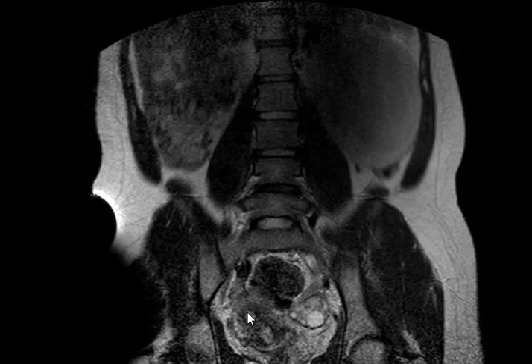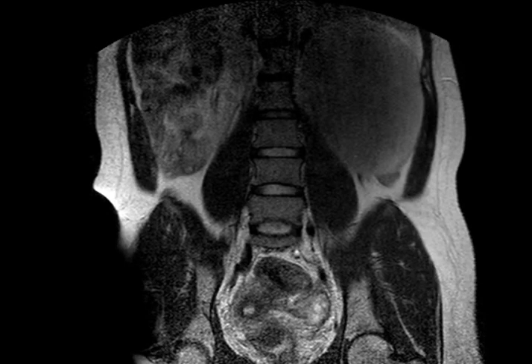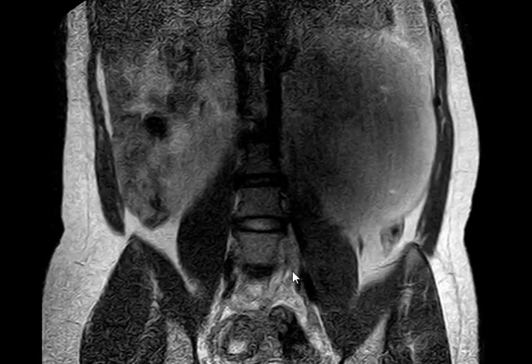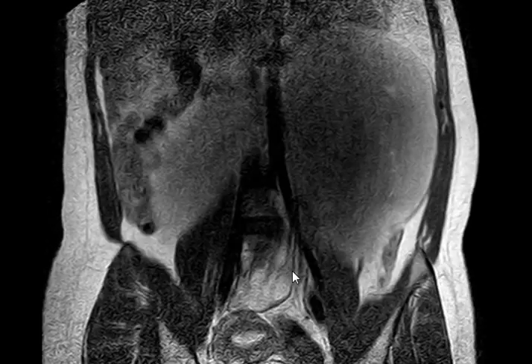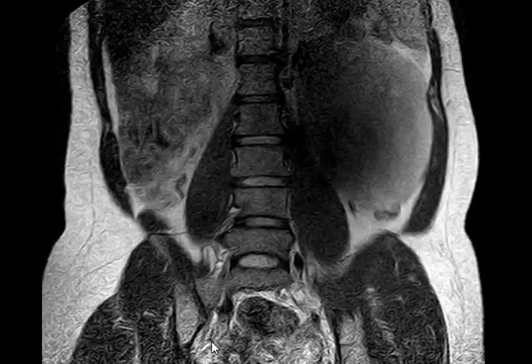Yes. The right ovary, where is it? Checking for it. Sorry. If you like, you can see other sequences. Just wait a second, because there are multiple. We did it several times to get a good image of that. Let's see this one. The same. It is T2, no fat saturation, and this is the uterus, and this is the ovary. The other ovary I still cannot see. Okay.